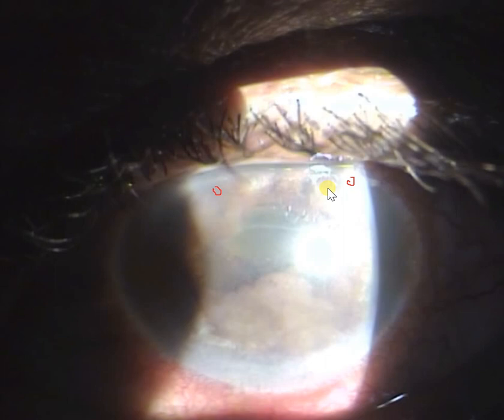And once that is achieved, then your aim is to go and do surgery and release the posterior synechiae, and then use VisionBlue to stain the capsule, and then do either a phacoemulsification, or you would try to remove that capsule as well and leave the patient aphakic, so there's no posterior synechiae formation. And if you choose to put in an intraocular lens, then a heparin coated lens would be the treatment of choice. Well, the long-term complications would remain glaucoma, endothelial decompensation, and there's also a chance that while you're doing surgery, you can try to open some of the peripheral anterior synechiae.